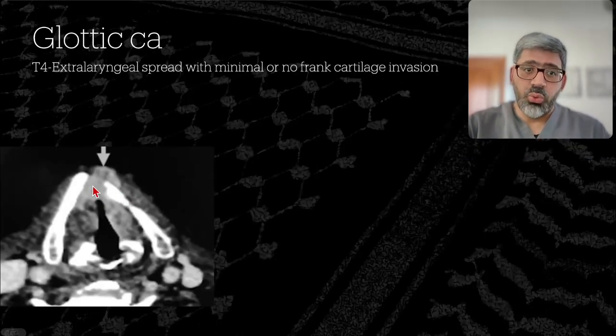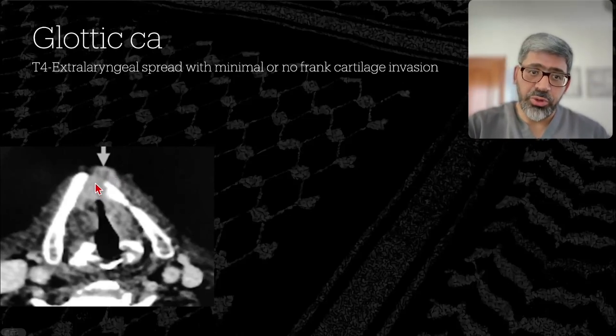This is another one where the tumor extends into the extralaryngeal tissues, but with minimal cartilage invasion. And this is a tumor that extends through the thyroid cartilage notch.